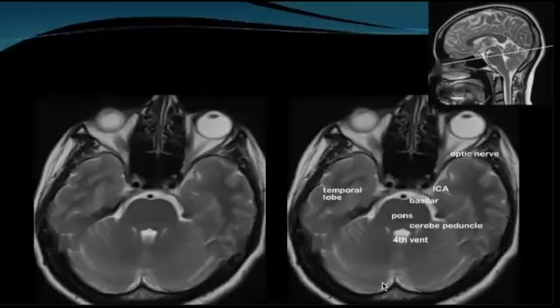So now we're moving a little bit downward at this point. Then we should start looking at this image. Here, we're supposed to identify the structures. I don't think the levels on the slides are very correct. I'll have to revise them.